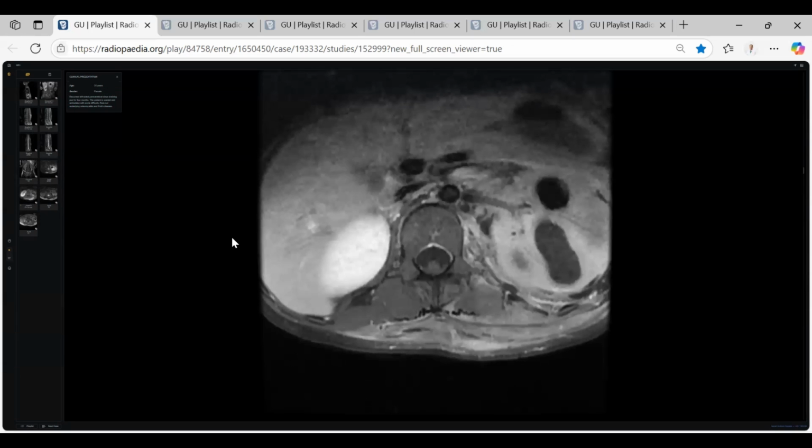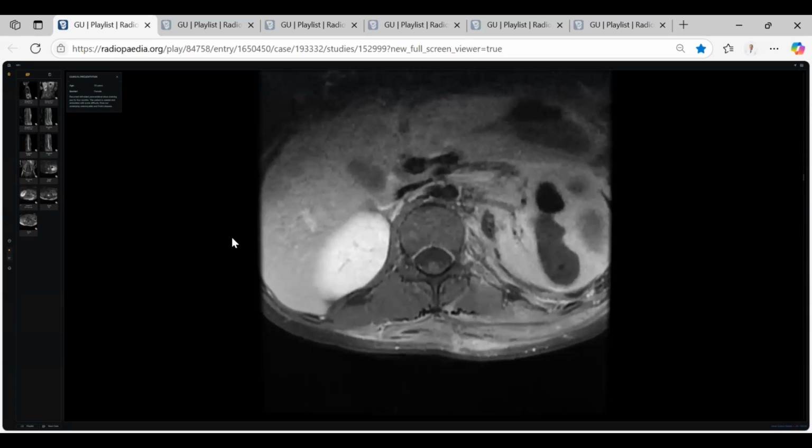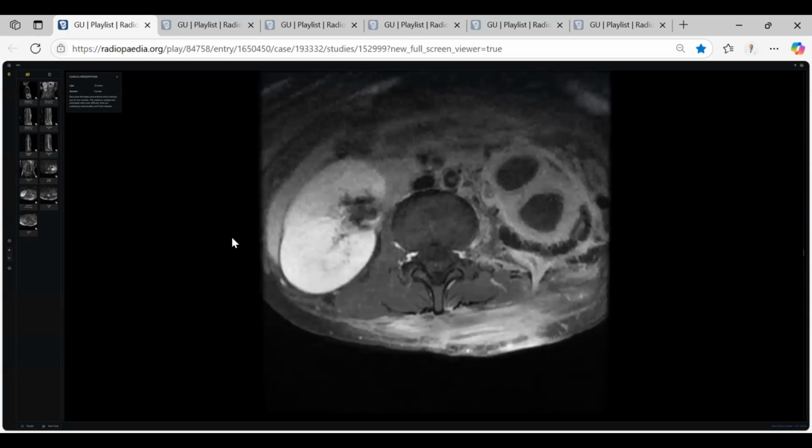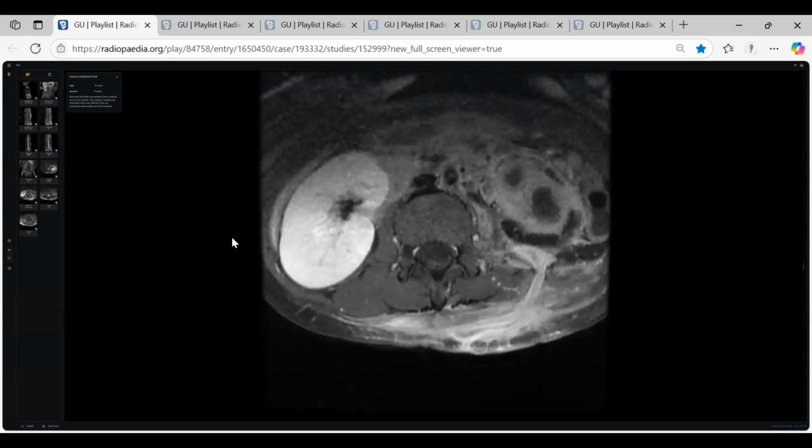So this is a medical emergency. I would urgently pick up my call, tell the findings to the referring physician, and refer the patient to urosurgical emergency for management, as it has a mortality rate of up to 80%. And I can see there is also a tract located posteriorly, likely indicating that the abscess has ruptured into the soft tissues and has passed up to the soft tissues of the posterior side, the back of the body, as well.